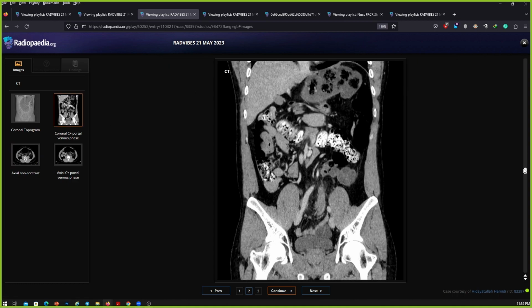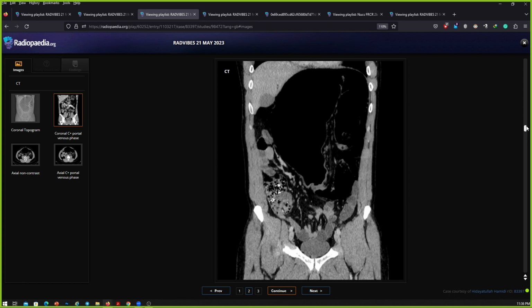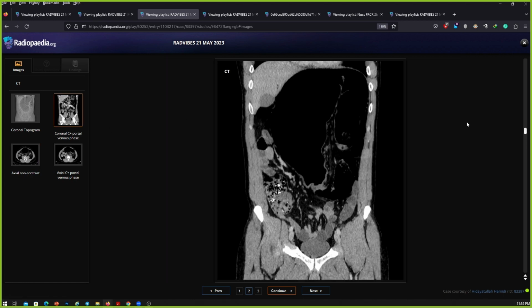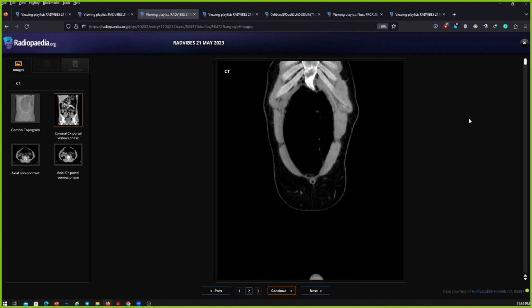Candidate 1, before you look at the other sections, I would ask you to request first. Yeah. Can I have a look at the coronal section? Which section do you want? Coronal. Yeah, it's all yours now. Thank you.